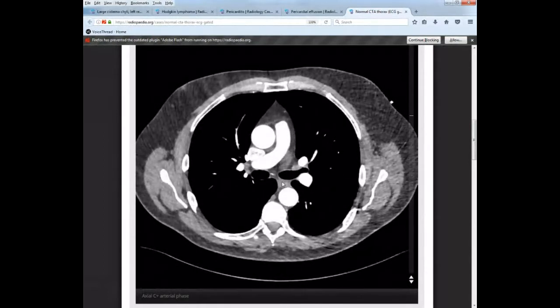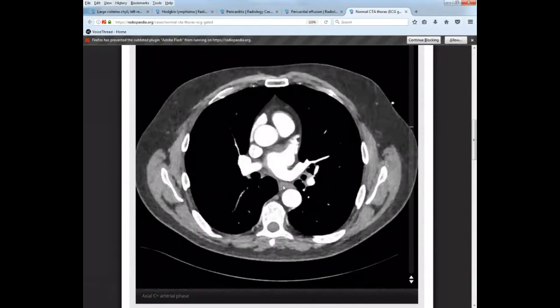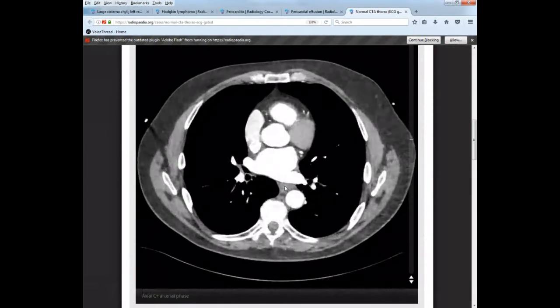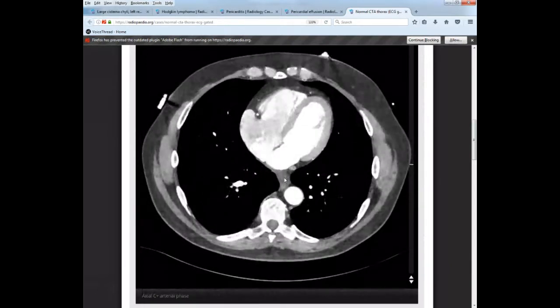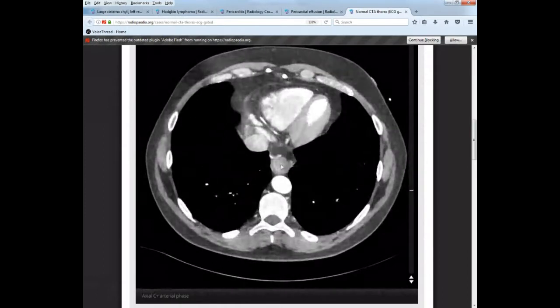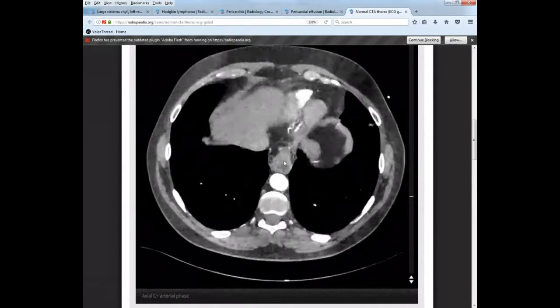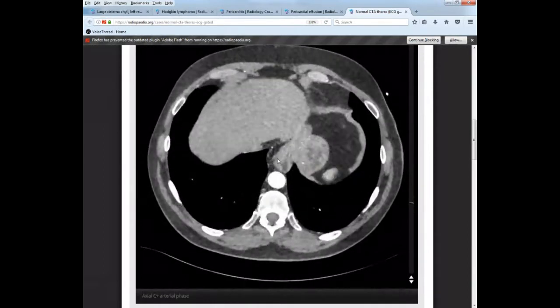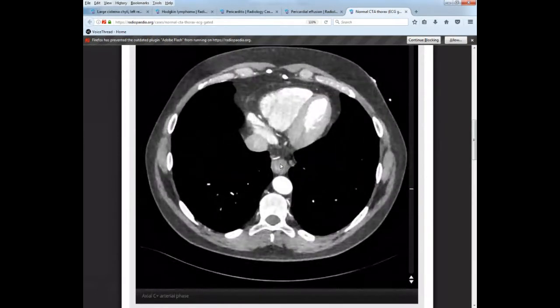Okay, we're below the carina. Okay, and remember the esophagus, there we go, is going to now go a little anteriorly, just inferior to the heart. It's going to start to move anterior. Here it goes as it empties into the stomach right here. Okay, there's your pylorus. I'm sorry, your fundus. Pylorus is inferior. There's your fundus. It's emptying into the fundus. Okay, so there's esophagus.